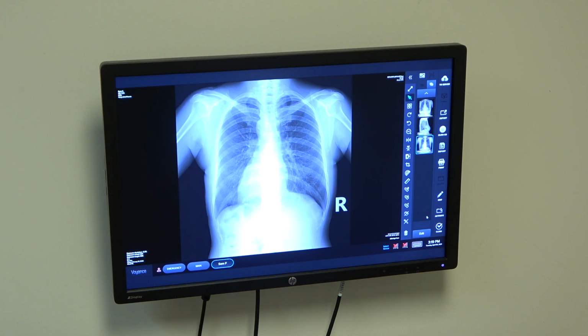Then we would go back to the first study and cut that image out. We just made sure that it transferred over correctly. If you're confident enough, you can just cut it from the beginning, still come in and paste it into the correct study. So that's a very nice feature and a very easy one to use.